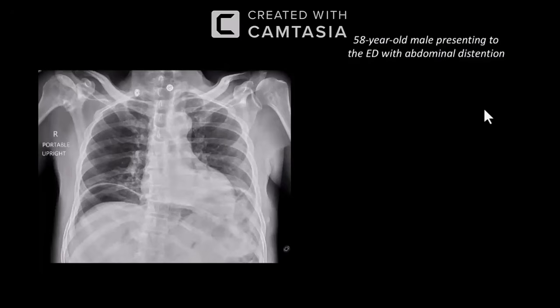So the findings are that this patient has features of pneumoperitoneum, discussed urgently with the surgical team. They need a CT abdomen and pelvis to further investigate this. Also, the findings are suspicious of a retrocardiac mass, which probably could be appreciated on the CT abdomen and pelvis, but the urgent finding is the pneumoperitoneum.